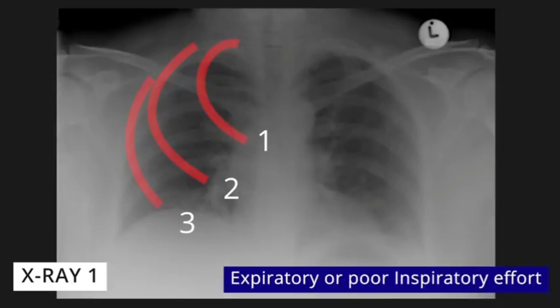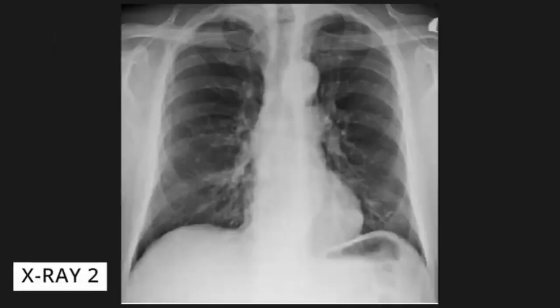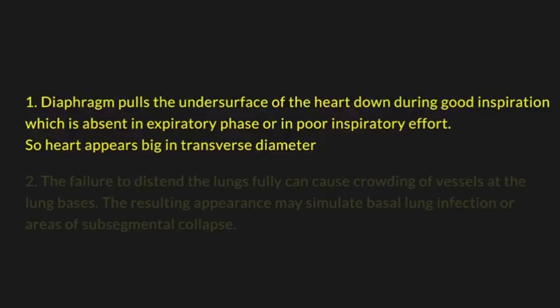You could, which flows right into I for inspiration. Dr. Madan makes a big deal about counting ribs here. Why is counting ribs so important? Because x-rays require a really deep breath. You need to see about 5 or 6 anterior ribs above the diaphragm. Anterior meaning the front part of the ribs. Yeah, the front. If the patient breathes out, the lungs deflate and the blood vessels get all crowded together.